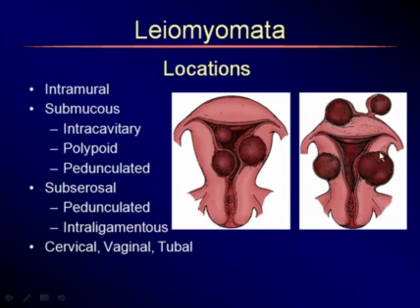If the fibroid gets very large and abuts the mucosa and serosa, then it's a transmural fibroid with a small submucosal and subserosal component. That's important for the clinician because if you describe it that way, they know they're not going to be able to get this out hysteroscopically nor laparoscopically. They're probably going to have to do laparotomy to go in, remove it, and sew up the hole. Or else there could be a uterine perforation if pregnancy forms, etc. Or they may try other methods of treatment.